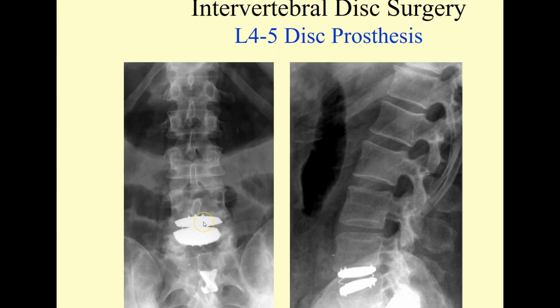Just an example of some of the attempts to replace living tissue with artificial structures, and there's varying degrees of success. I think the patient does need to very much limit their activity, so it really is not a return to your previous life kind of scenario. Failure remains a common problem here as we've seen complete disruption of this version of a disc replacement, and while this is in place to help us identify the center, you can clearly see it's extending beyond, and this part has failed, and they will have exaggerated movement and very painful movement as a result of this.